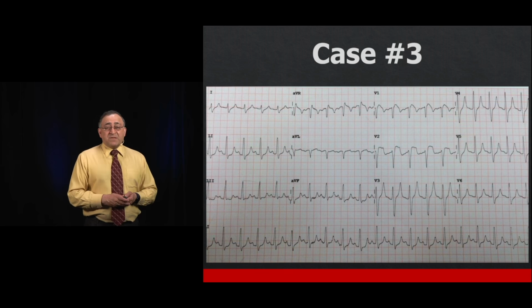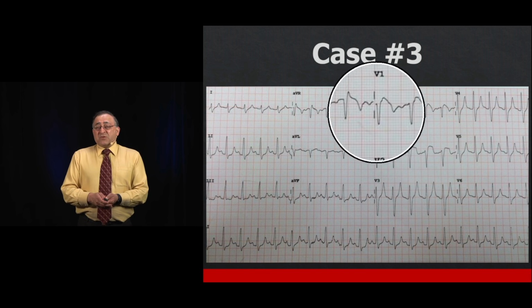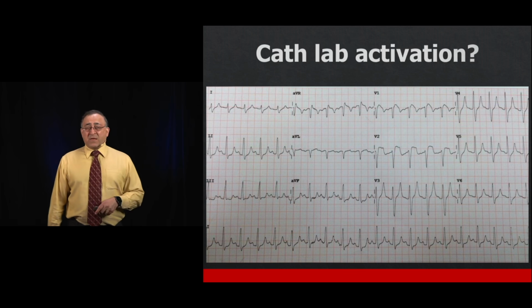And how do you know this isn't a PE? Well, it could be, except for the fact that you do a history and there's nothing suggesting PE, and you actually see some nice peaked T waves. And that pulls you away from PE, and it means this is hyperkalemia.